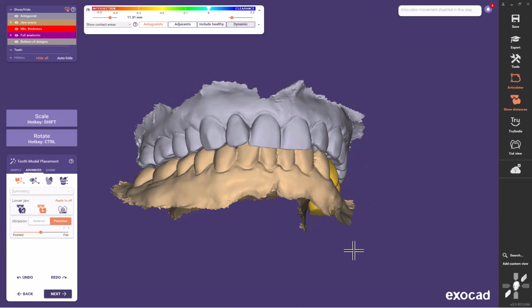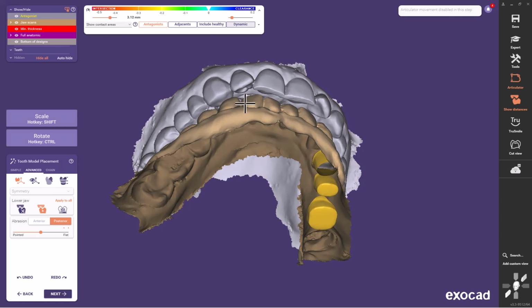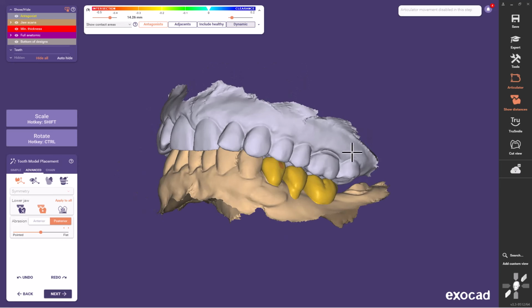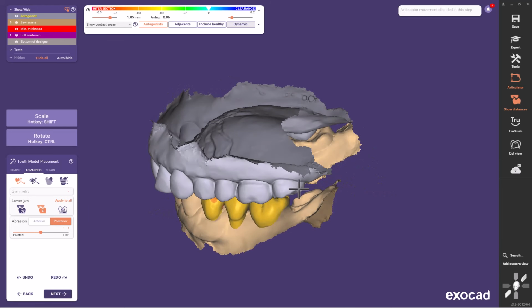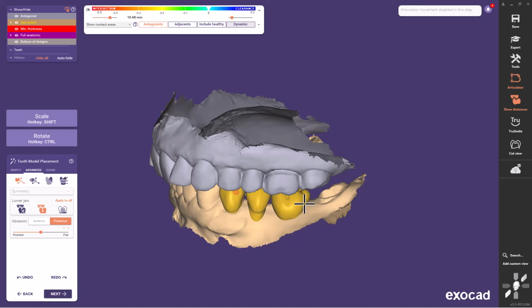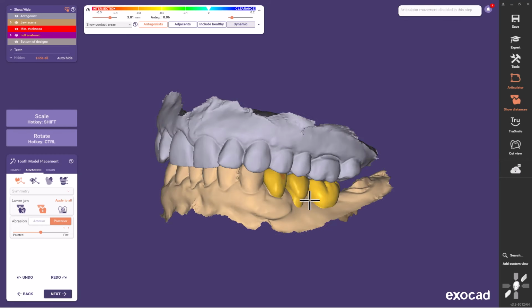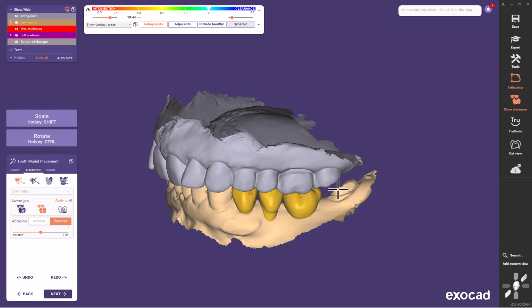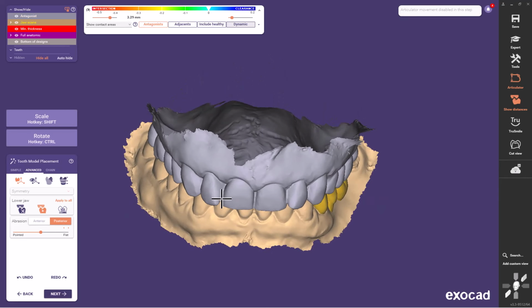So now, what is my treatment plan? Well, my treatment plan is an occlusal equilibration, crowning the two upper cuspids, two implants down here with crowns that'll be splinted, and a single crown here at tooth number 21. We're going to just take this tooth out. It's badly damaged. She doesn't want to do a root canal and fix it. She'd rather have this right here. And I think that's all that she really needs. Although you certainly could do a root canal and probably restore this tooth. It's a little bit of heroics, but not excessively. So we can certainly work with that.